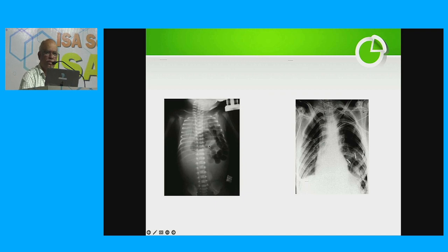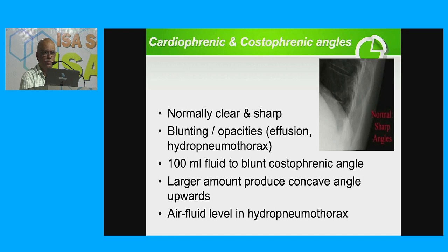Here you can see a diaphragmatic hernia, congenital diaphragmatic hernia. The examiner can ask anything about pediatric anesthesia. But this is a traumatic case in an adult, with intestinal loops visible through the ruptured diaphragm. So these are all diaphragmatic lesions.